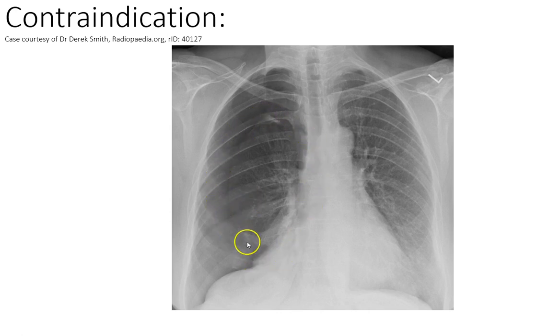This is pneumothorax. As physios, we can't treat this, and indeed if we were to treat a patient with a positive pressure device, then we could make this substantially worse. So it's really important, if we see a pneumothorax, we don't use any IPPB, CPAP, PEP, or anything that could cause positive pressure until, or at least unless, there's been a drain put in and the drain is working.